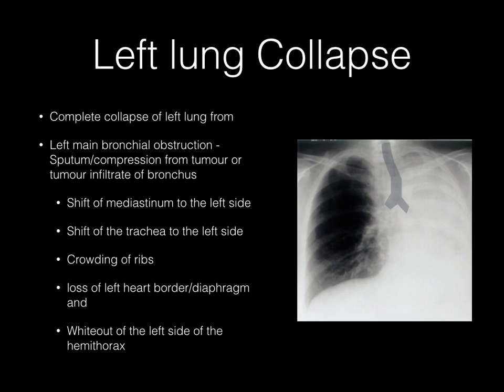Now, on most occasions, even if there has been a sputum plugging, for the chest x-ray to demonstrate a complete whiteout, it might take a few hours. So even if there is a complete obstruction of the bronchus, it might take a few more hours before a complete whiteout is visualized.